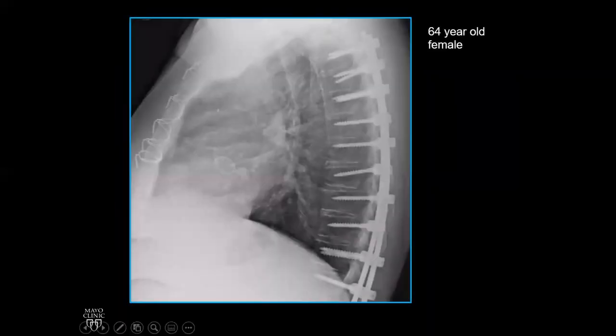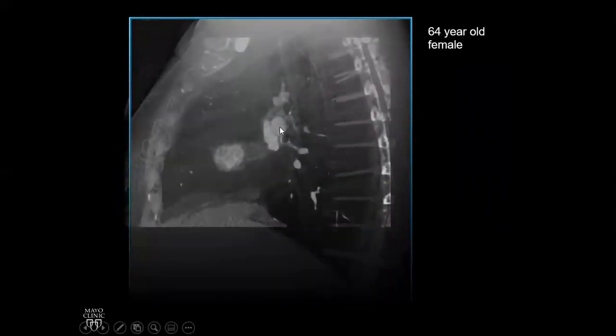Different patient, 64-year-old female. And again, we see a nice, well-demarcated opacity here in this patient. Person has an aortic valve replacement. Here's our trachea. Let's look there. If we go out laterally, this is our pulmonary artery, our interlobar branch. It's a branch of the right pulmonary artery. And in front of it, we have the right upper pulmonary vein. These two together make that opacity on the lateral radiograph.